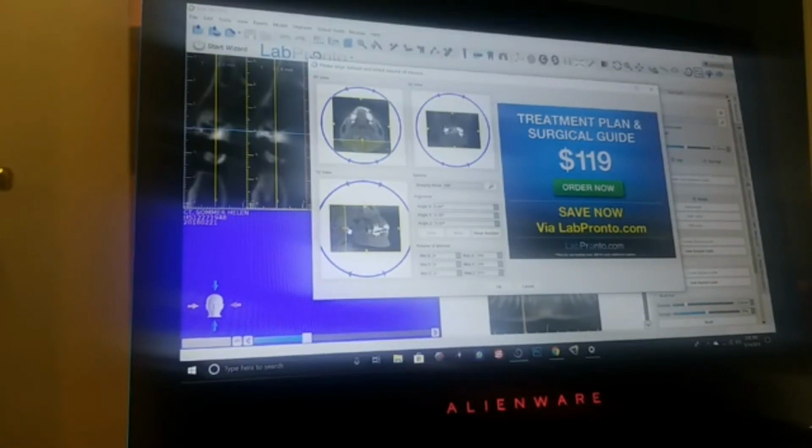There are certain images that you really are not looking to have as part of your project. The DICOM images are very heavy, and you don't want to store too many images on your computer because it's going to kill a lot of your memory. So you want to eliminate as much as you can that is not related to what you are looking to do. For example, take a look at this image down here.